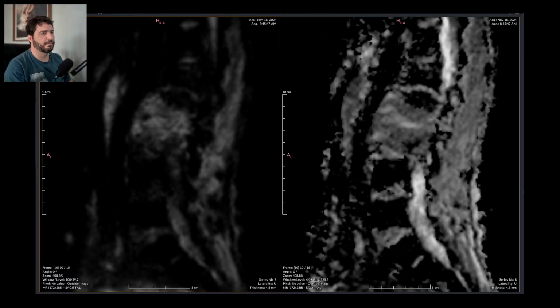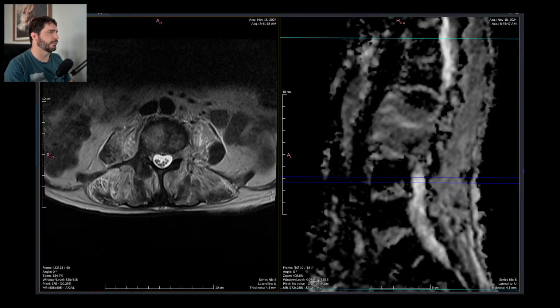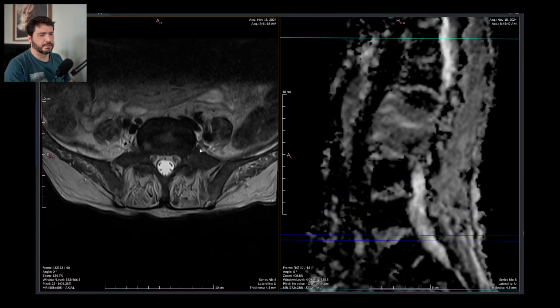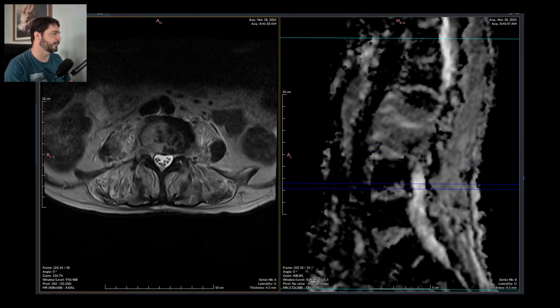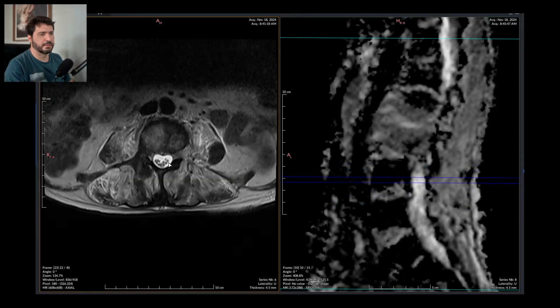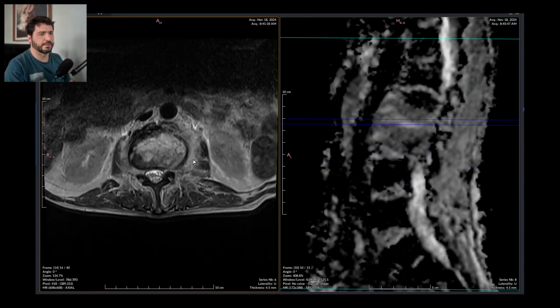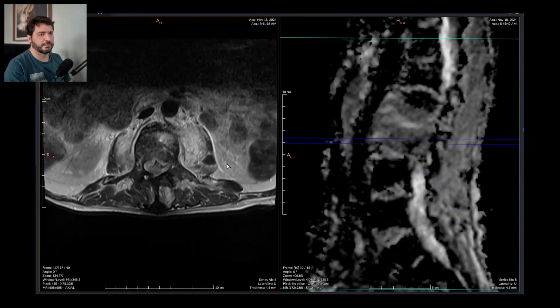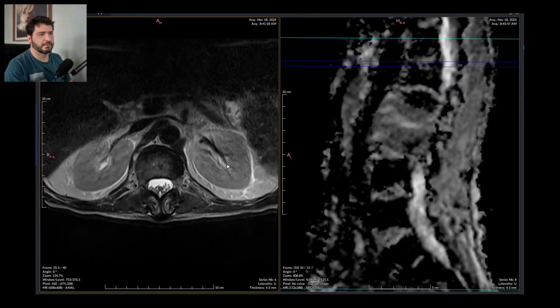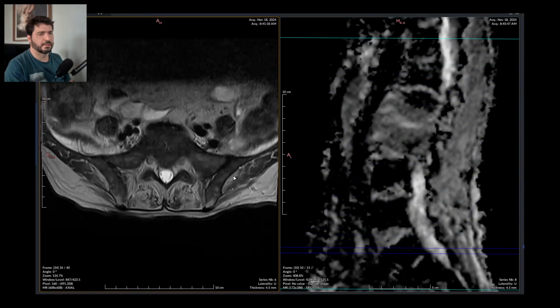I suppose it could be. There is stenosis right there. And there is diffuse atrophy of the muscles. There is synovitis of the facet joints. And indeed, there is some very severe. The paravertebral muscles are also atrophic. It's funny because kidneys seem fine, at least in size.